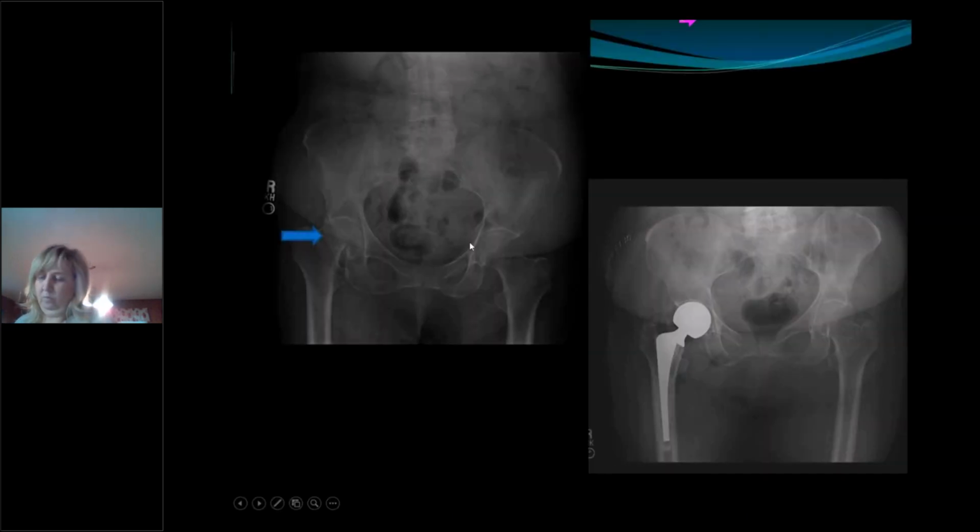Picture on the left, before we jump to the blue arrow, let's go to the other side. If we look at Shenton's line, again, we draw that up. It's really a nice concentric soft half circle. If we do that on the contralateral side, we see there's clearly abnormalities.